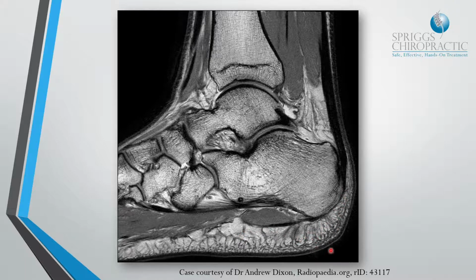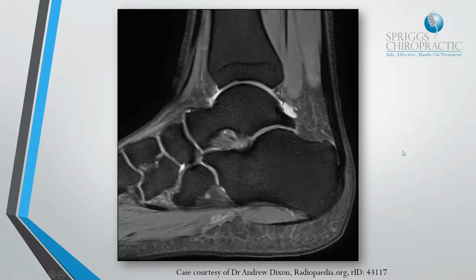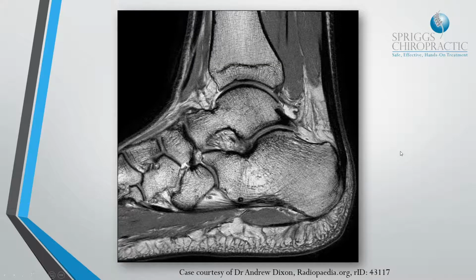So when you're poking around the skin of the underside of your foot, just here, you feel as though you're directly onto the bone, but there's quite a lot of mass between you and the actual calcaneus itself, which is always really interesting for people to observe. And this is a T1 weighted MRI. So this is T1, where the fat signal is really high. So obviously bone marrow, and obviously the fat signal through the calcaneal fat pad is very bright.